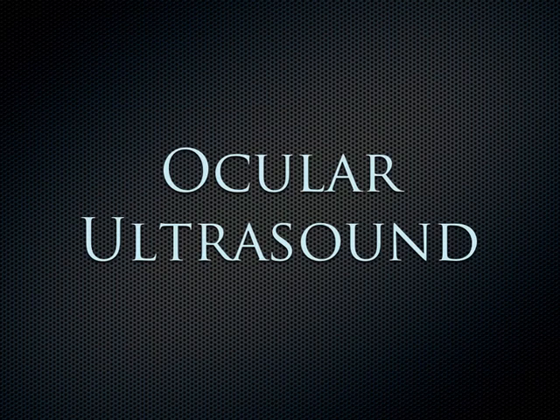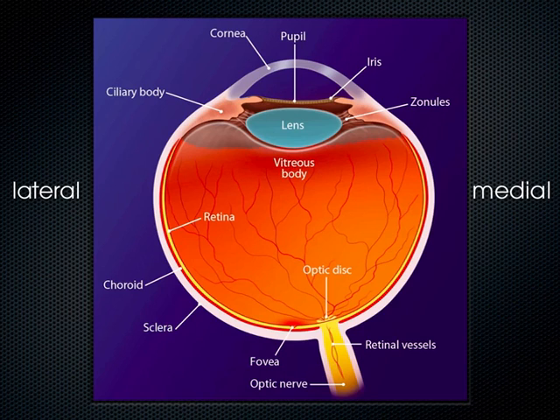Very briefly now, we're going to talk about ocular ultrasound, and the most important thing to keep in mind regarding the anatomy of the eye is that the ora serrata is seen here anteriorly. This is where the retina is attached right out here at the ora serrata. It's also attached always back here, just about always at the level of the optic nerve. So it's always tethered here at the ora serrata, and then back here at the level of the optic nerve. This is the fovea of the eye. Here we can see the optic nerve coming down here with its vasculature.